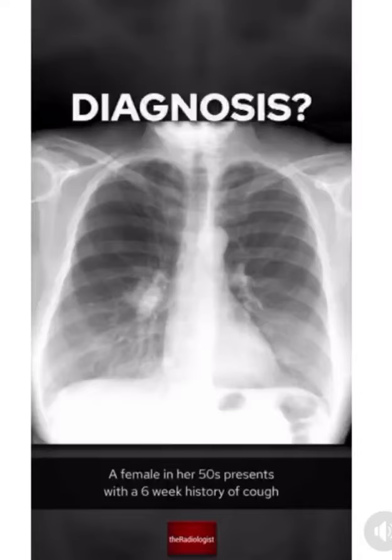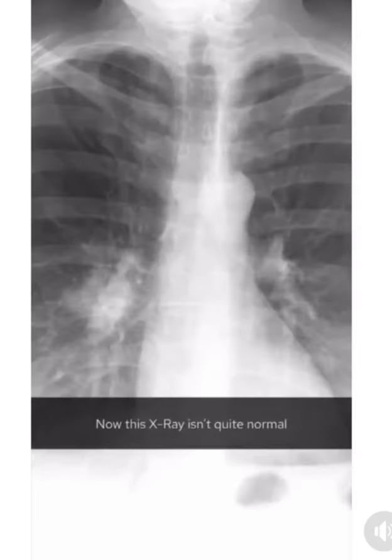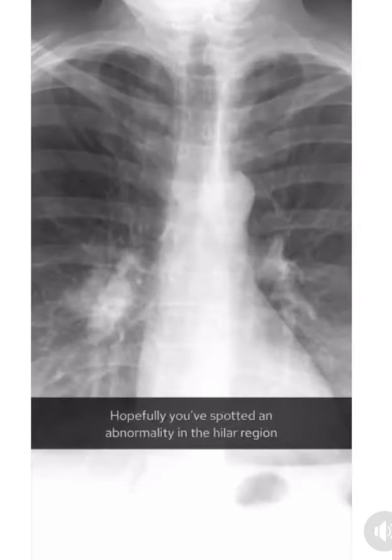Presents with a 6-week history of cough and has a PA chest x-ray. What's the diagnosis? Let's go through the case. Now this x-ray isn't quite normal. Hopefully you've spotted an abnormality in the hilar region.